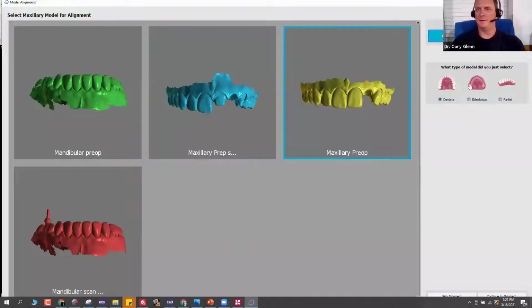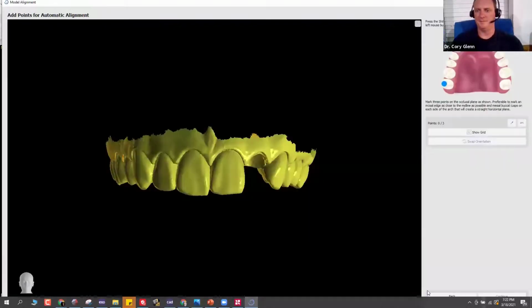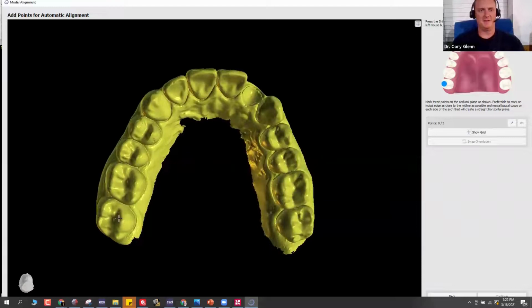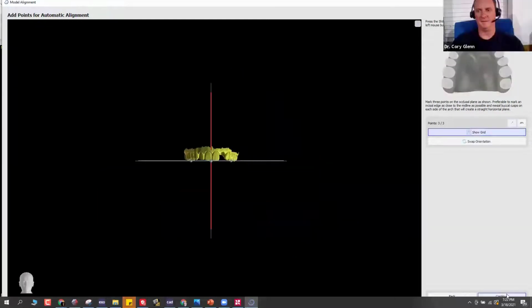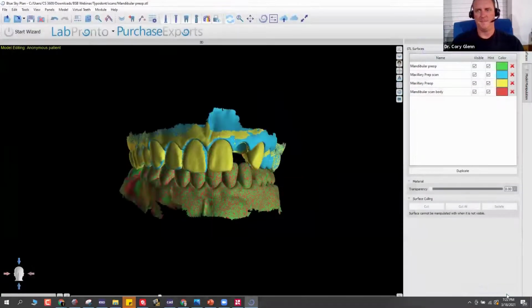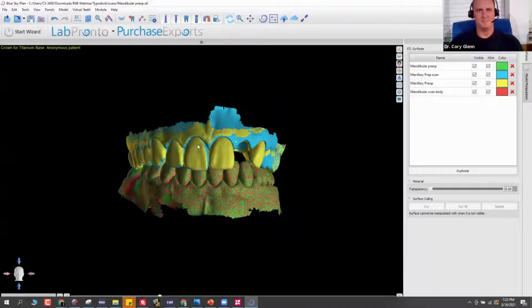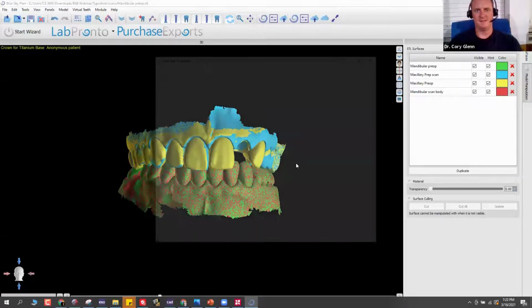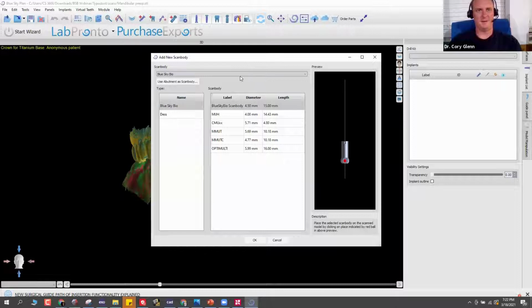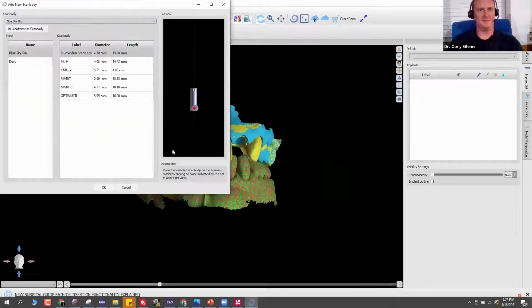All right, y'all are getting a lot of practice at this one. Just going to align this real quick. If it's aligned, you could just skip the alignment. Yeah. There. I don't know why I did that, but it just needed a restart.